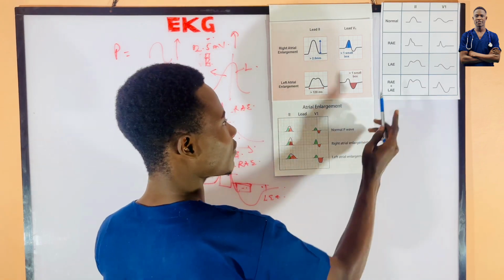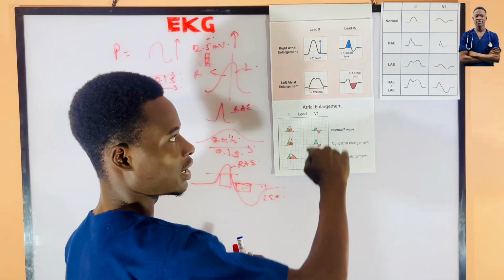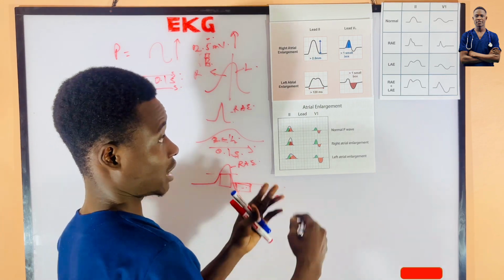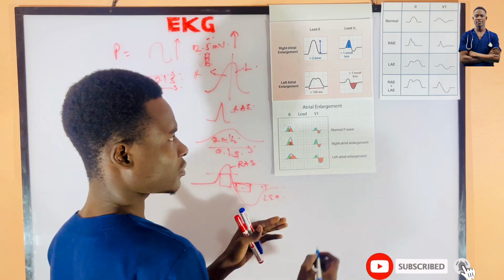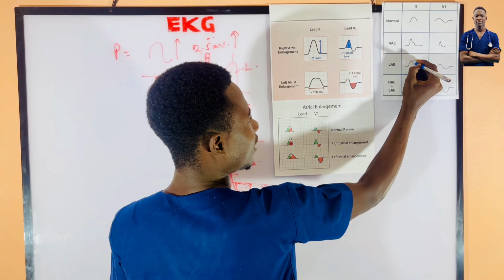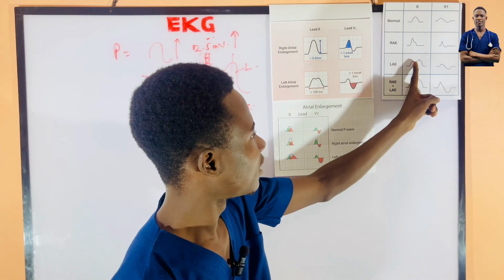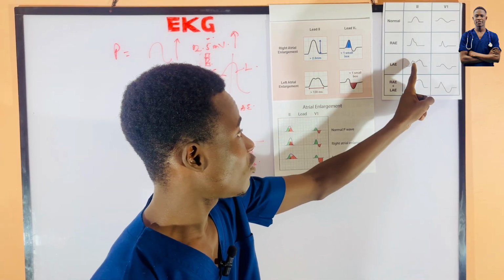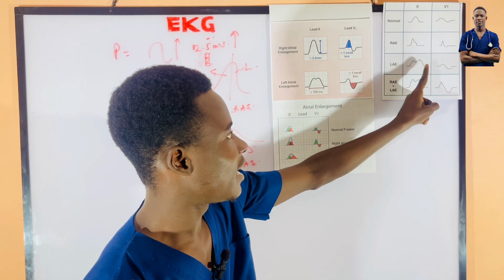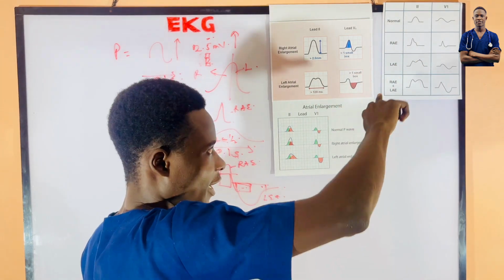Now, let's look at something here. This wave, we call it a bimodal. It's like M, a bimodal. So if you take a bimodal wave, or that is the P wave, when the P wave is a bimodal, the apex, or the maximum height of the first wave and then the maximum height of the second part, you see we have a curve over there.